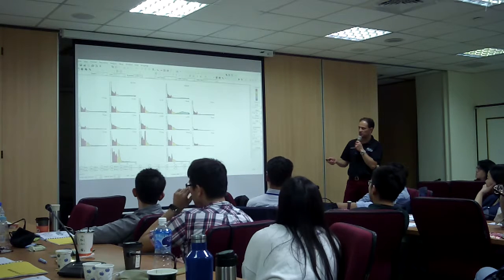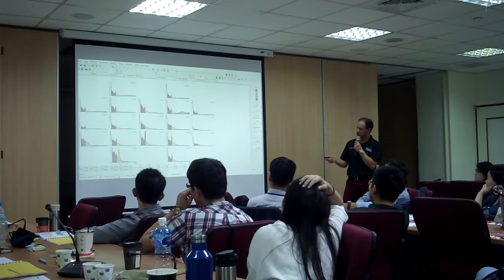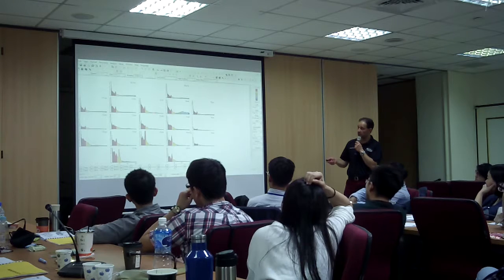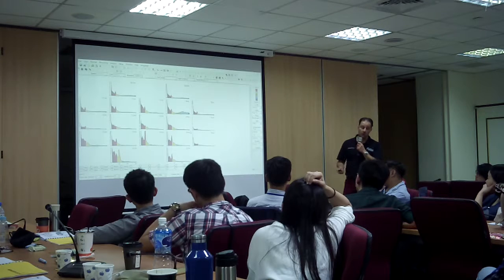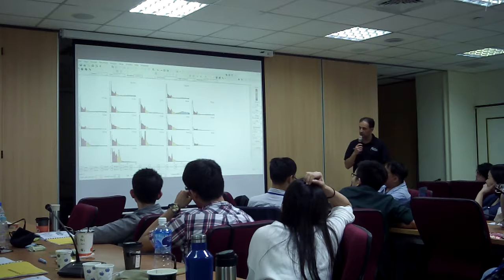So yeah, that's EMG, don't worry about that, because I didn't filter it out. So this is EMG, this is EMG, this is EMG, this is EMG. But we have some slowing here, in the frontal cortex too. And that's executive functions, right? Now, if we do PZ, we need to take care of that of what? What was the thing that's lower than we want it to be?